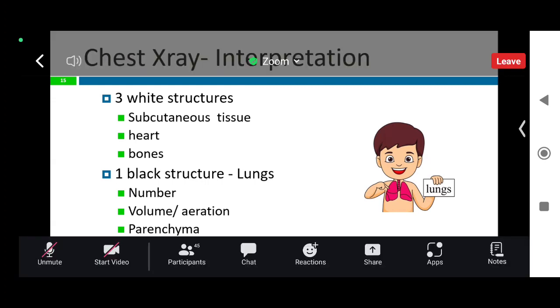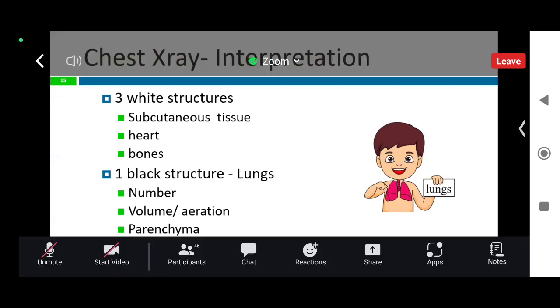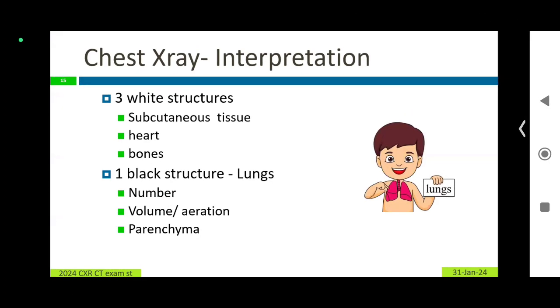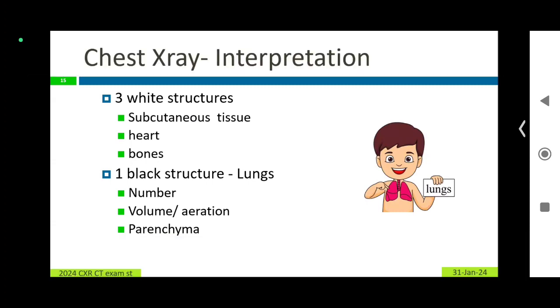Postgraduate who was like me when I was doing my post graduation. I'm not a brilliant student. I know, like a common sense pediatrician, you need to decipher, is there anything going wrong? If you ask the radiologist, they will say, you come from the lateral aspect to the medial aspect, don't miss out anything. But for you to interpret easily, remember three white structures.